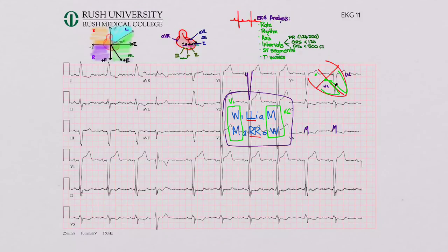Okay, so what did we say before? I think we said that we had some T wave inversions in the lateral leads, which we do, and sometimes that happens with left bundle branch block. So it's important to look at an old EKG and see if that was there before. Does this represent something new, or is it something that we don't have to worry about because it's old? So we have a left bundle branch block in this EKG.